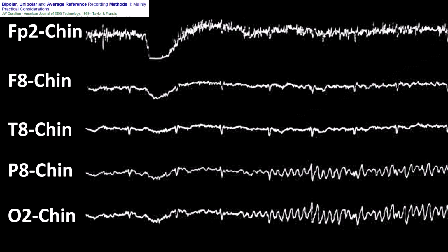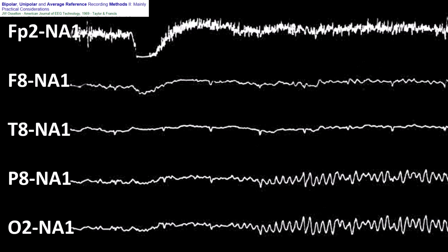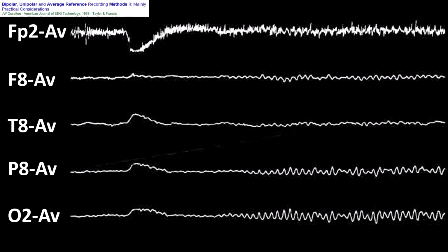In this frame, I am showing you an epoch using common electrode reference montage referred to the chin. You can see that the alpha rhythm is present in the two lower channels. In this new montage using a just below the left ear common reference, the activity can also be well appreciated. Here we see the same epoch viewed using average montage. Here the activity is still present posteriorly, but the amplitude is slightly decreased and it has moved more anteriorly. That is, the activity now can be seen in more anterior electrodes.